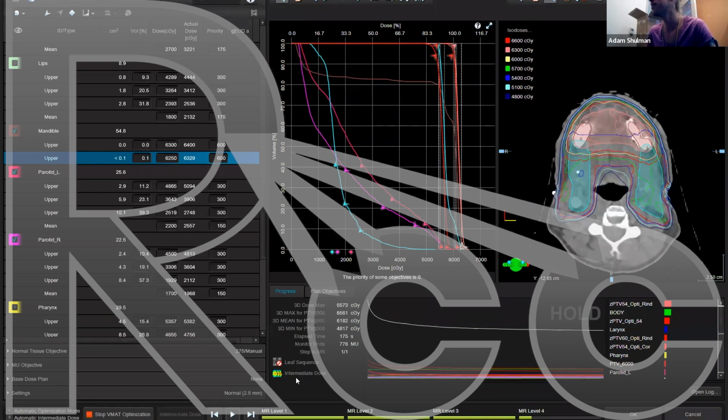So it swells a little bit, then you just exacerbate the swelling with that extreme dose buildup. So that's why you never want to optimize to the skin surface.